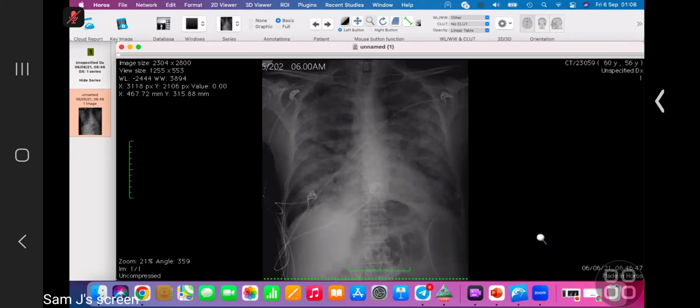Patient is having a dry cough. Okay. Is there a cavitary lesion? I'm suspecting a cavitary lesion with a thick wall at the left mid lung zone. And his CD4 count is 300. Dry cough, CD4 count 300, so the patient is immunocompromised.